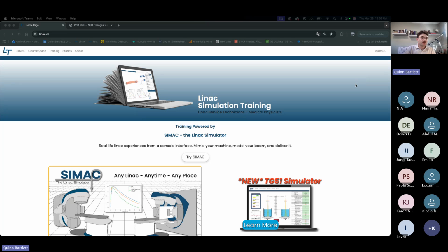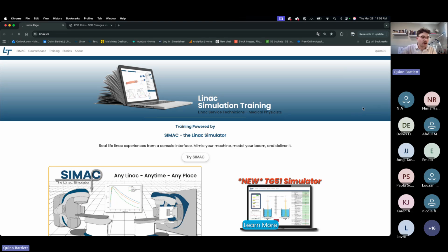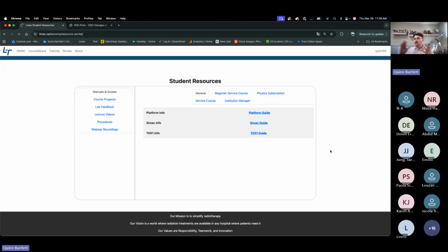And so our student resource portal, sorry, I have this tab from the video in my way. Where we can find the student resource portal is we click our username in the top right. My drop down looks a little different because I'm an admin, but basically we find this student resources here. And this is going to be our starting place. If you never know what to do on the platform, we can always go to the student resources. It's going to give us some manuals and guides of how to navigate around the platform.